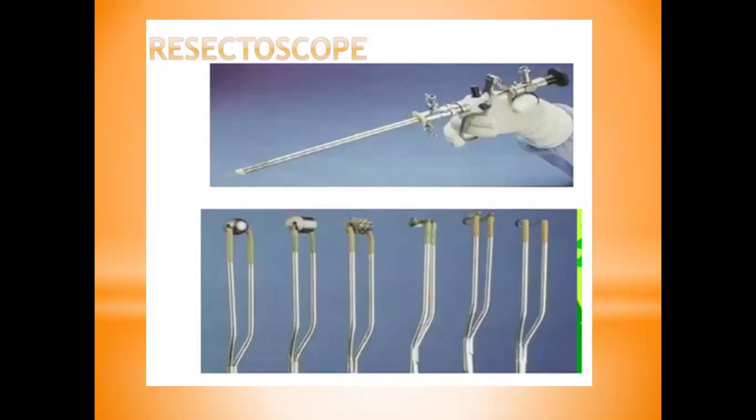What about the real instruments to handle inside the uterus? If you are diagnostic, you just look and remove the scope. If you want to do any manipulation, you need an instrument. The important instrument is called the resectoscope and is used only in operative because it has a large diameter. The resectoscope is connected to an energy source like the cautery, mostly bipolar, or unipolar could be used.